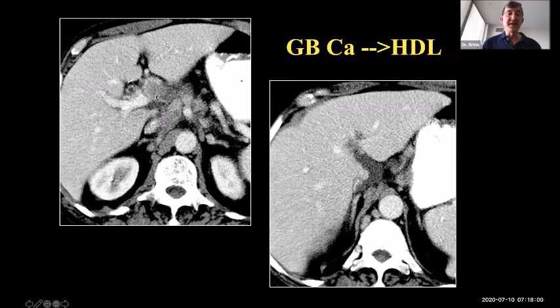And in this case, we see it also all the way up into the porta hepatis. This is nodal metastases spreading all the way up to the porta hepatis, all within the hepatoduodenal ligament from this patient's gallbladder carcinoma. It also gives us another little added tidbit here. This is some fluid surrounding the caudate lobe in a rather characteristic reverse C-shaped configuration, the letter C in reverse.